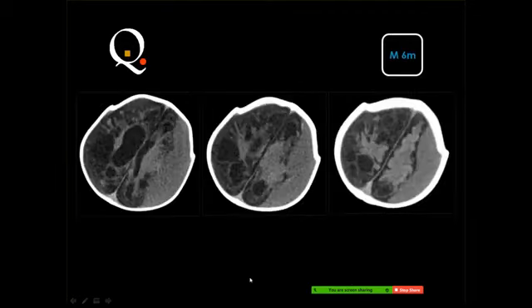Yes. Okay. Subdural hematoma. Right or left? Left. The remaining brain is normal. No, there is a ventriculomegaly. Yeah, hydrocephalus. Yes, and this will be discussed in great detail in the pediatric section.